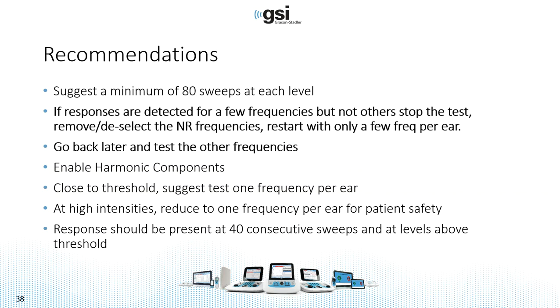And then finally, if you are getting a response, let's say you get a response at 80 sweeps for 1,000 hertz, you want to wait another 20 sweeps to ensure that the response remains. So you want at least 40 consecutive sweeps. And if you're getting a response, you should also have a response at levels above threshold, just like an audiogram.